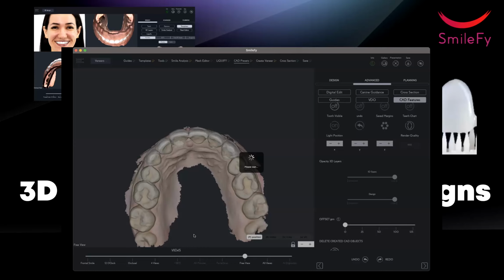And that's actually the workflow after the design for every single tooth. Again, we're going to add some more features to, for example, import the margins from the Medit scanner. If the Medit scanner creates the margin automatically, you can import them, you can adjust if needed, and then you don't need to set the margins. We will also add the feature to set the margins at the beginning. Maybe your lab assistant can set the margins, then they are set, you design, you have the margins, you can immediately create the veneer, right? So to simplify the work or to split the project, right?